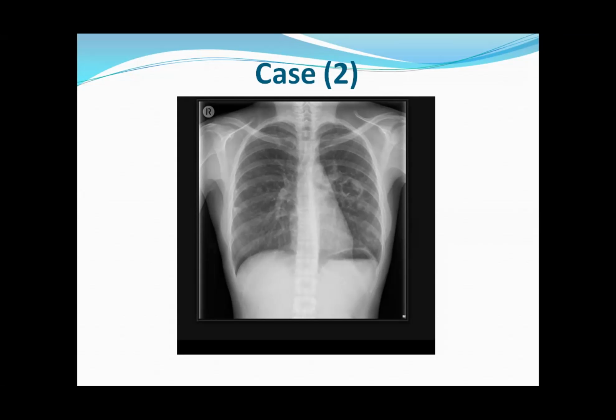There are a few ring-like shadows in the bilateral mid zones. No other nodular lesions are noted. In this case, no other pertinent findings with regards to the mediastinum or CP angle. The skeletal system also appears to be grossly within normal limits.